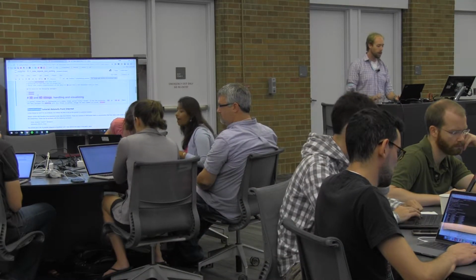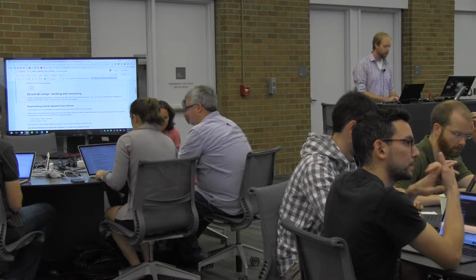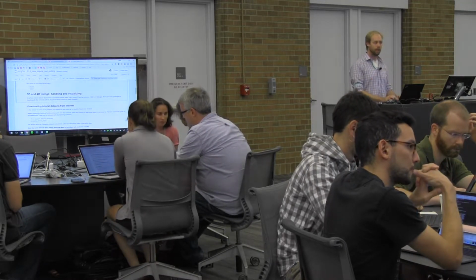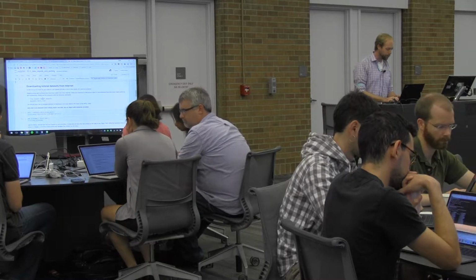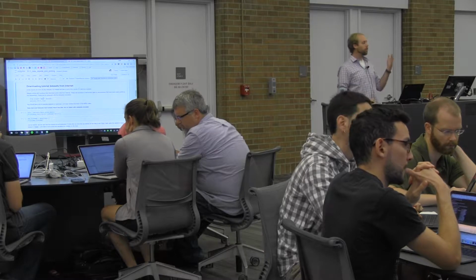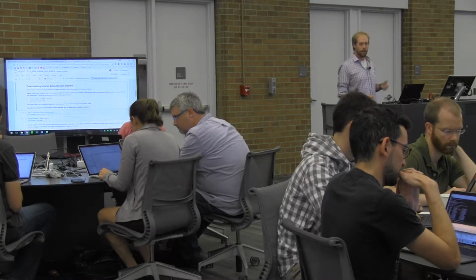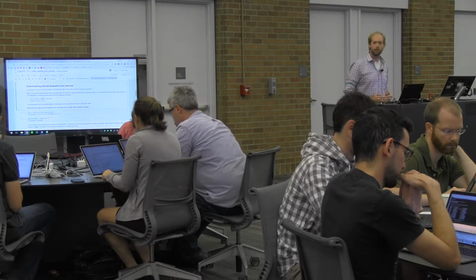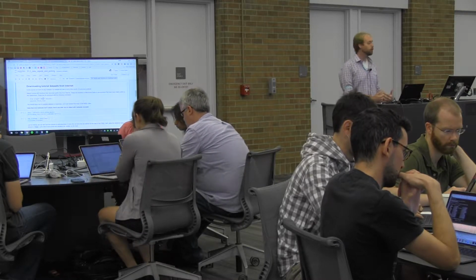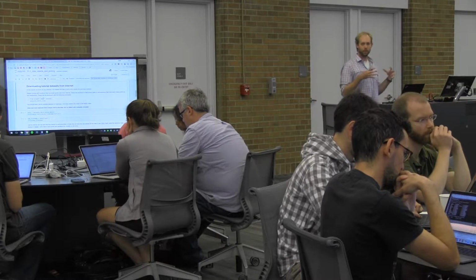The second thing that we're going to talk about is a package called nilearn, and this is effectively a set of tools that allow you to connect these neuroimaging structures with the Scikit-Learn stack and then go back again into the world of neuroimaging. So as Jake mentioned, in Scikit-Learn, you have a number of different functions that can be used to download different machine learning data sets. And as he mentioned, in terms of API, one of the really useful things that Scikit-Learn has done is in some ways define standards for how packages are constructed.